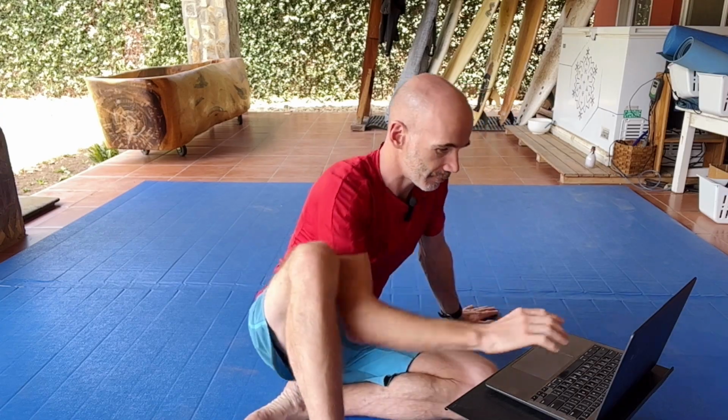Alright, the way I'm going to do this is a little bit different from how I normally do videos. I'm actually going to jump over to the computer and take you through some real life x-rays so we can look at them and help determine what you have, to make sure you do the right rehab for your particular curve. So let's jump over to the video and you can see what I'm looking at.